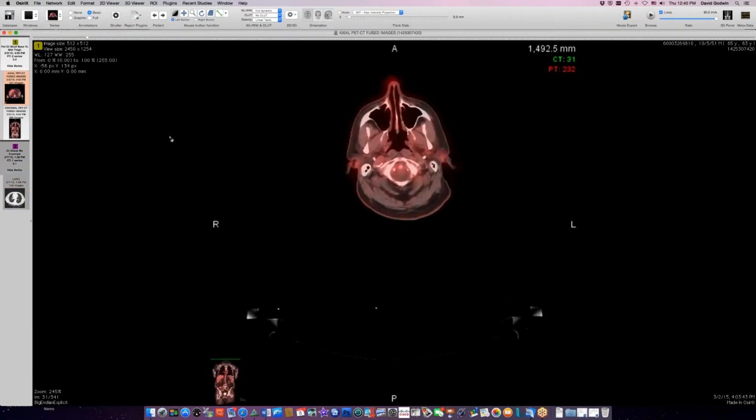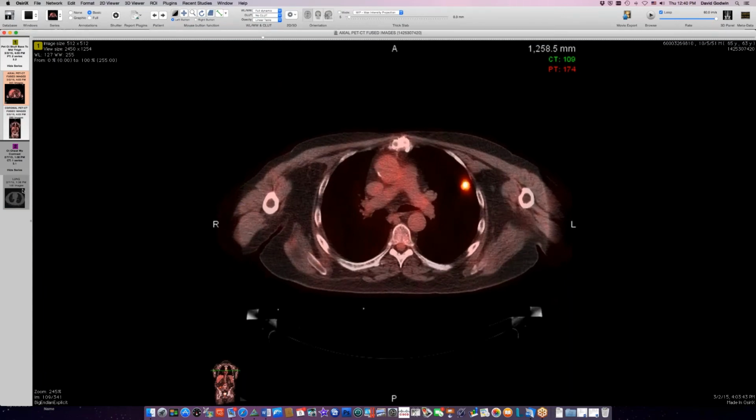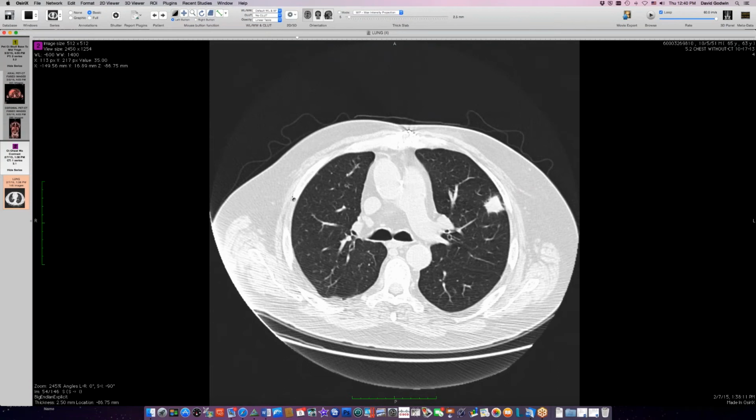We have a PET scan that shows that this lesion was hot, and this was biopsied, and this was Cryptococcus. Now, around here, we have to consider Cryptococcus gattii. It's like the northwest here, and so that's always a consideration, but this was not speciated. We don't know whether this is just ordinary neoformans or Cryptococcus gattii. But with lung nodules around here, Cryptococcus is definitely on our list.